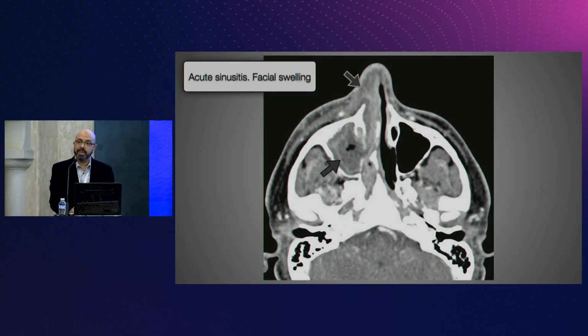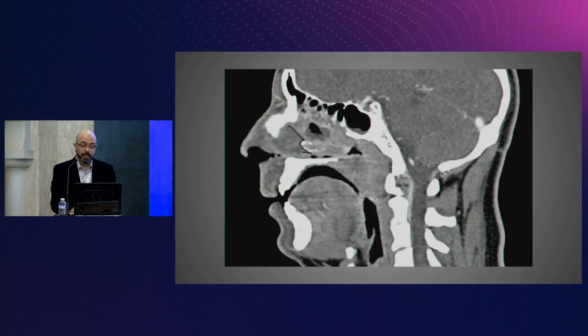Look here, what's that? This is cellulitis in the nasal soft tissue. If you look carefully, what is that? This is a subperiosteal abscess in the nasal aperture, right? On the sagittal view, you can still see it here. So this is no longer a take a pack of antibiotics and go home case. It is a theater case, right?